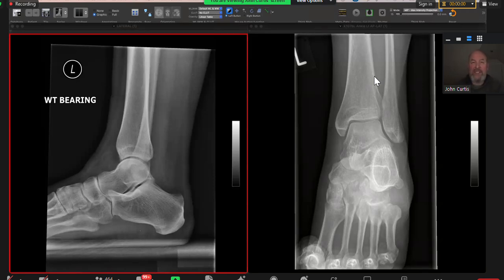Okay, and the same was true of the other side, but the patient was in excruciating pain laterally. What would you do next? Patient's a jogger, which I conveniently didn't mention. Okay, so it could be a stress fracture. So I would like to go for a bone scan and for follow-up.